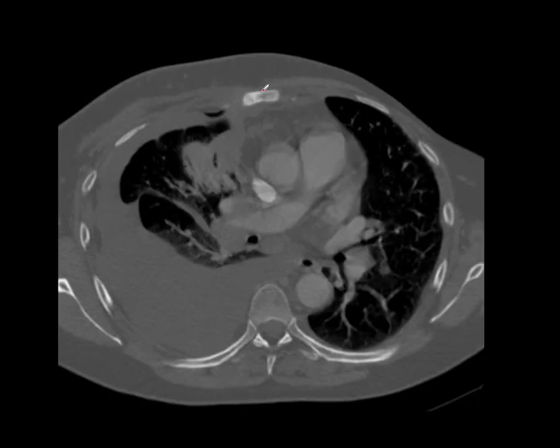And we can see the sclerotic abnormality here in the sternum, and it's quite often missed, actually. This patient obviously has a large pleural effusion as well, but the metastatic disease in the sternum can be missed. And if it's an isolated deposit, the patient may be a candidate for a resection of the sternum. So it's worth picking up.